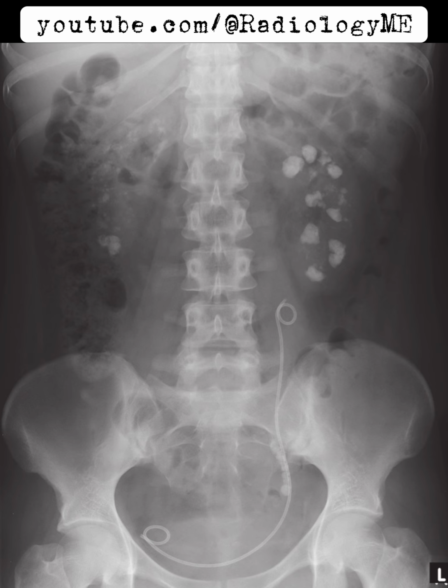Now let's think about what questions the examiners might ask you on this case. They could easily start by asking, what are the causes of nephrocalcinosis? Of course, medullary sponge kidney is a big one, but they're probably going to expect you to mention other causes too, like hyperparathyroidism, renal tubular acidosis, or even papillary necrosis.